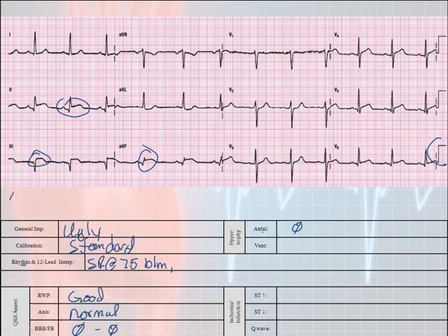Ventricular hypertrophies. I'm going to look over here. This and V5 and lead 2 looks like the bigger ones. And I'm going to say no over there. Now, do we have 11 millimeters of R wave here? That's 5, 10, no. How about 12 millimeters over here? This looks like it starts on baseline, and that actually might be 12 millimeters.